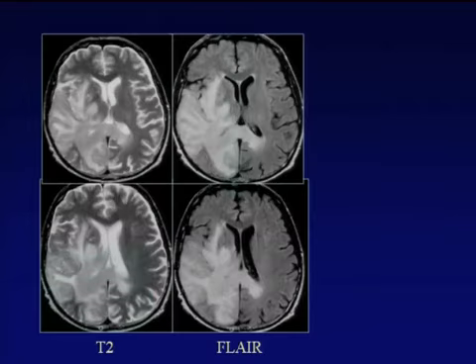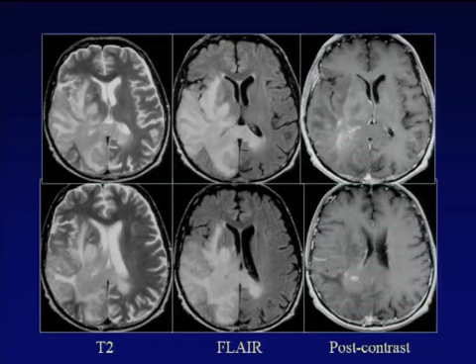And this is another very aggressive looking tumor. Very large tumor. You see the solid part, all this gray. On FLAIR and T2, this is the tumor and the edema. And somebody would expect that post-contrast there would be very extensive diffuse enhancement, and it's not the case here. You see only this minimal degree of enhancement. And this is, I believe, a take-home message: dealing with intracranial primary tumors, sometimes the degree of enhancement does not reflect the degree of malignancy. And this has an explanation.